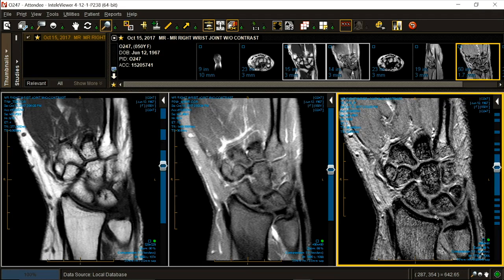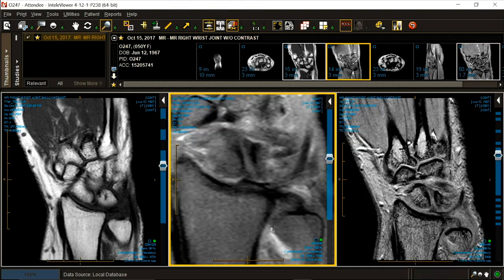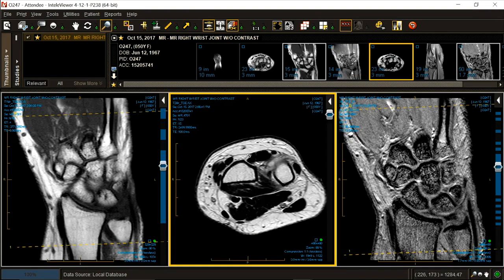What do I allow? Millimeter of width. And some cartilage on either side. Look very carefully. Erosion. Okay. Now it's time to go short axis.